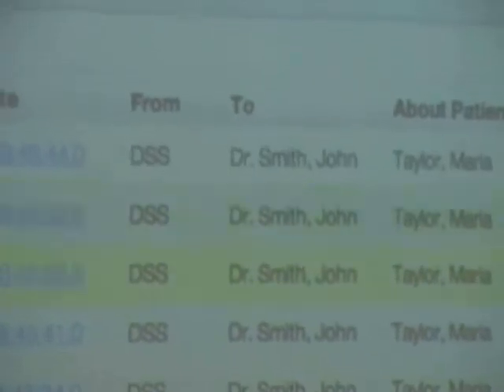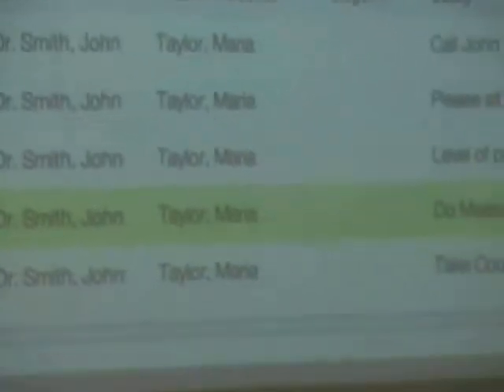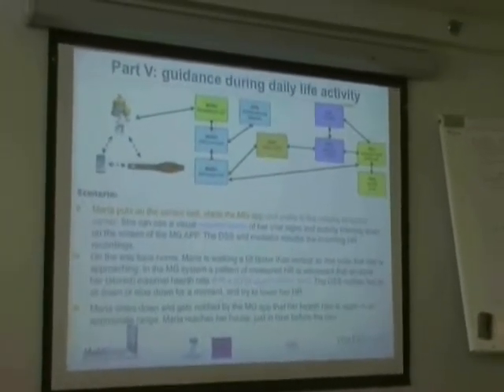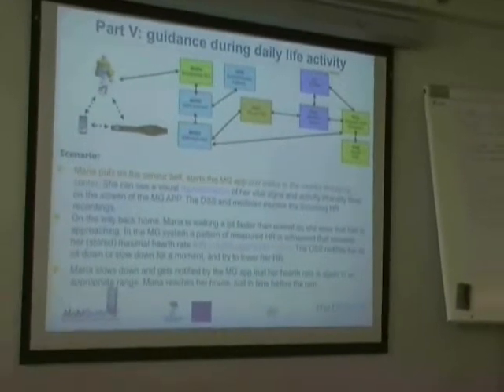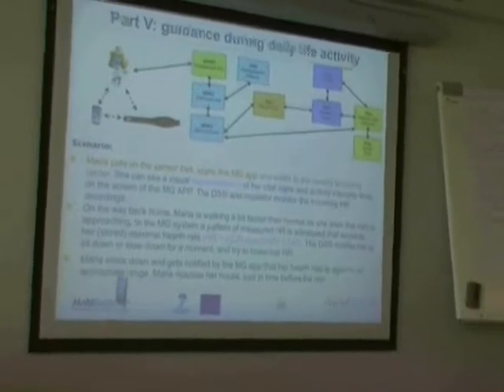So just for your information, in the caregiver interface, all these recommendations are also shown. The caregiver interface has a connection to the PHR to retrieve all the recommendations which are given by the system. Monitor for unsafe pattern. In this case, when she would get into the range of her maximum heart rate, which is defined by the Bruce test before.